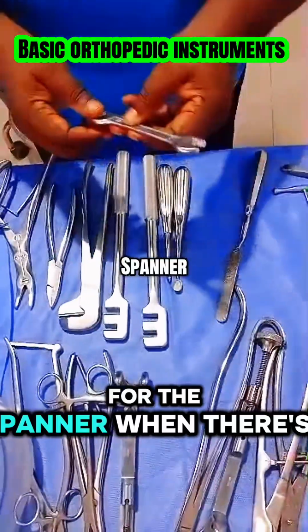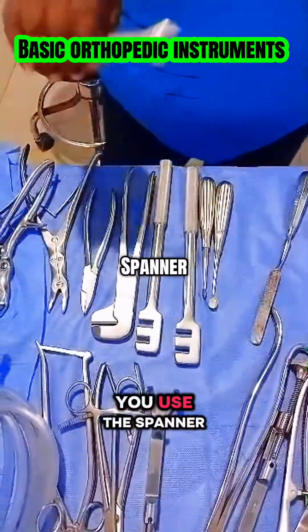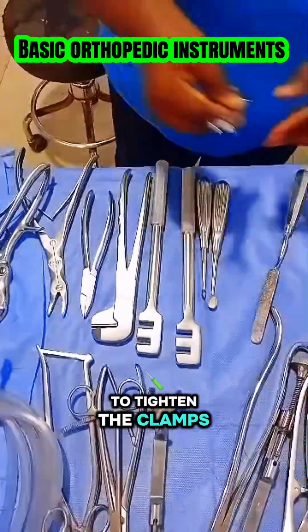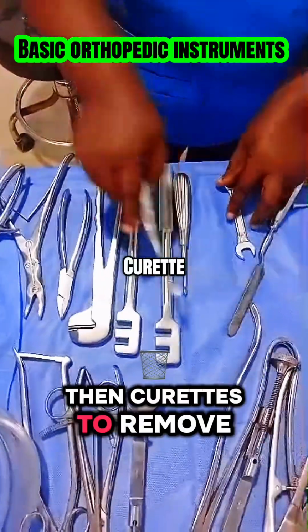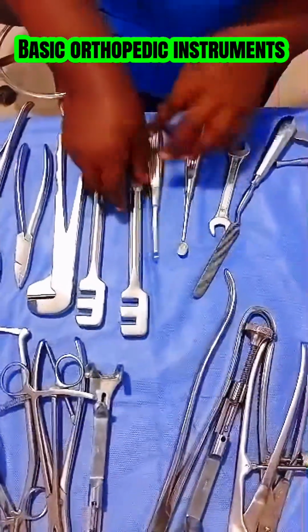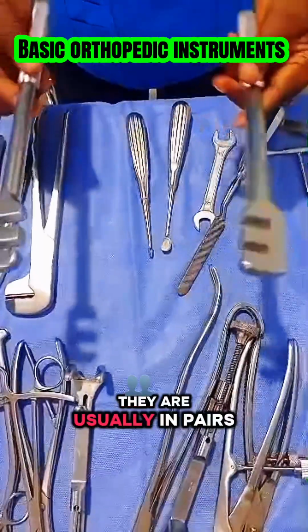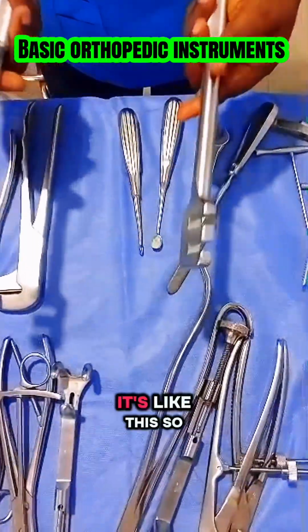The spanner: when there's a fixation, you use the spanner to tighten the clamps. Then curettes to remove bone debris, to clear it. So this is the plate bender. They are usually in pairs. It's like this.